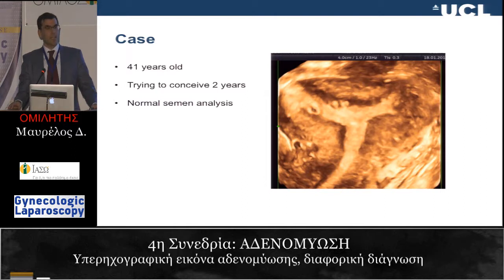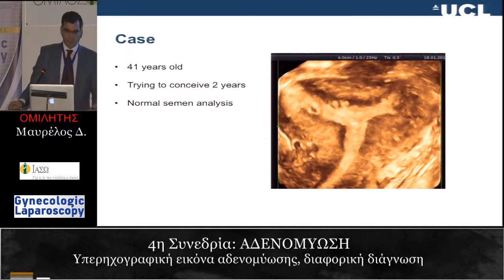She had a scan by a sonographer in the community who was very worried that the woman was pregnant, because there was a big cystic area in the myometrium and she didn't know exactly what it was. So they did a pregnancy test, they did a serum beta HCG, and brought her back for another scan. She had another scan, and still they weren't quite certain what it was, and eventually she came to us.